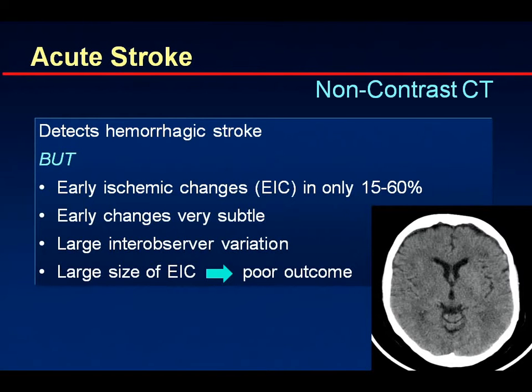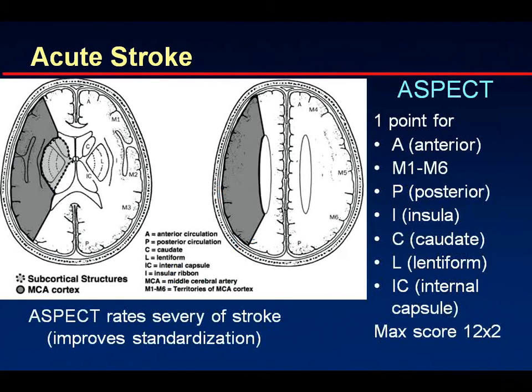Yeah, left frontal might be. The right side could also be something, but if you look at the basal ganglia, you see that you do lose them in this area. But if you would say that something's going on here, I would not say no. It shows you how difficult it is in these early stages.